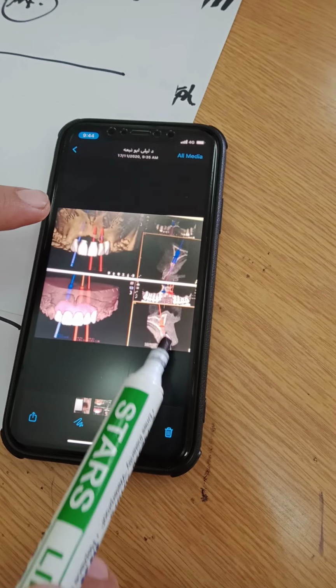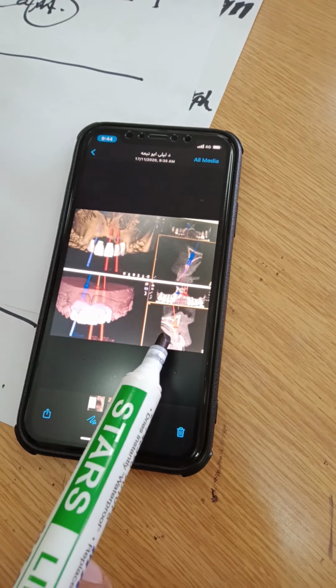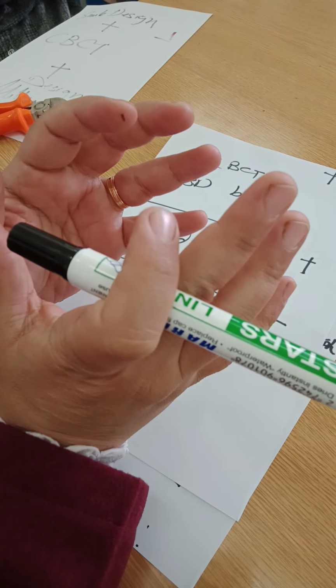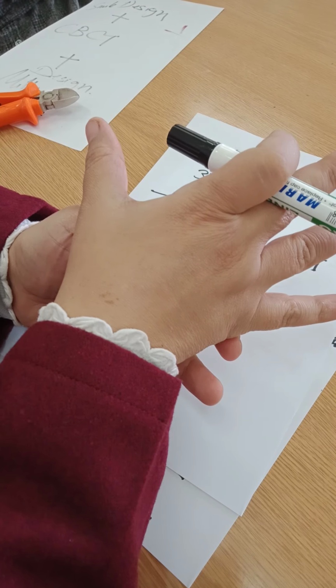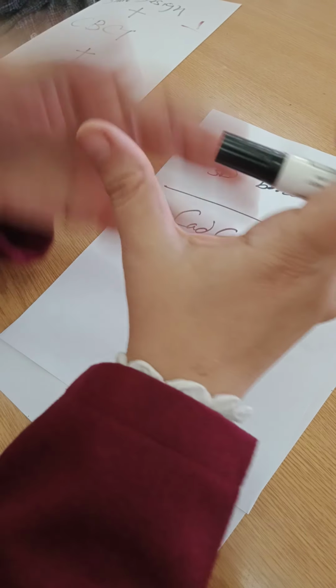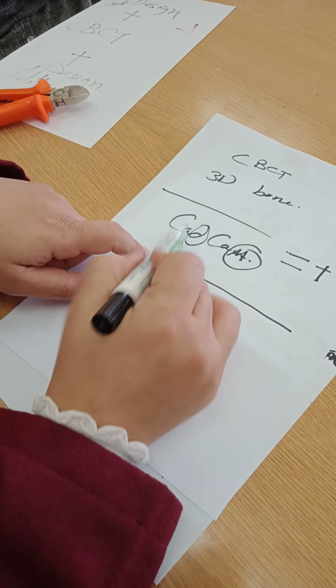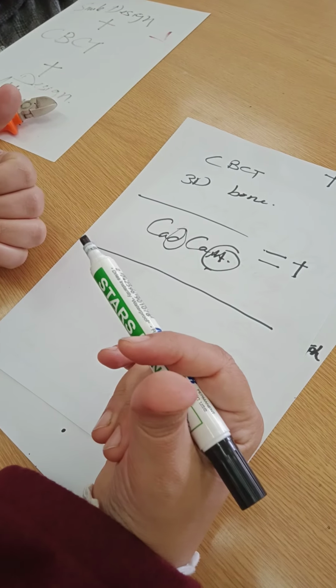You also see the amount of soft tissue you need to add, not only the bone you need to add, but also the soft tissue. So I'm looking for a system. This is only 2D, but they're looking at the soft tissue. The first one in the video was overlapping the facial and intraoral camera images to the CBCT. The second image was overlapping the 2D smile design with gingival morphology, concentrating on the gingiva in comparison with the bone volume that they want to add. So I'm looking for something going even further, where you can also design and mill your final restoration based on these. What we actually have in our clinics is the following.